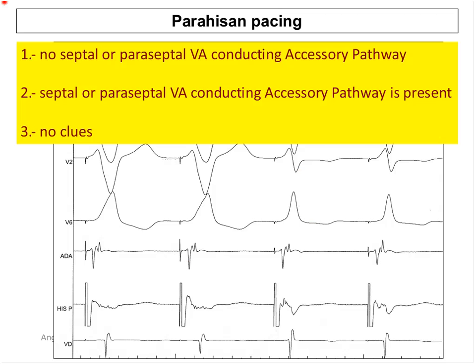No, I like also to stress that even now the morphology of the atrium is not modified. So we can say that most of the atrium is depolarized through the accessory pathway. It's a very fast conducting accessory pathway. Great, absolutely. Actually, it's impressively short VA interval. The pacing site must be really close to the ventricular insertion of the accessory pathway. Probably para-hisian pacing, or para-hisian accessory pathway. Yeah.